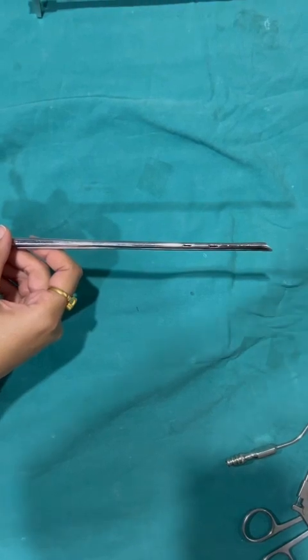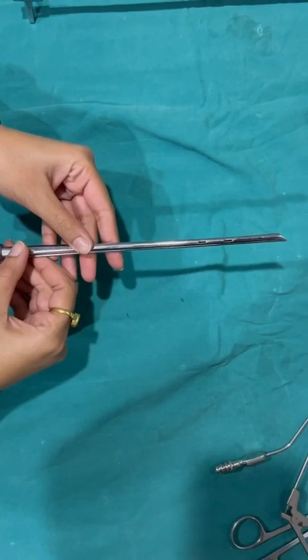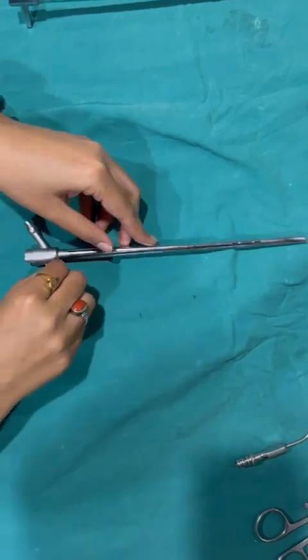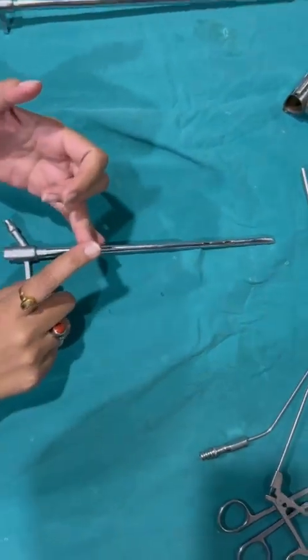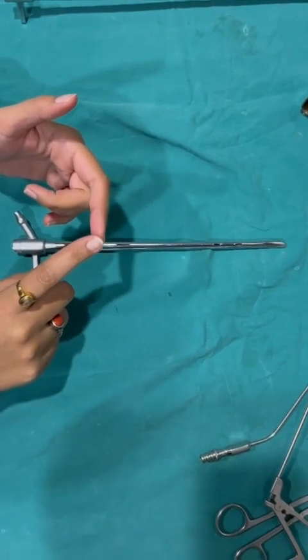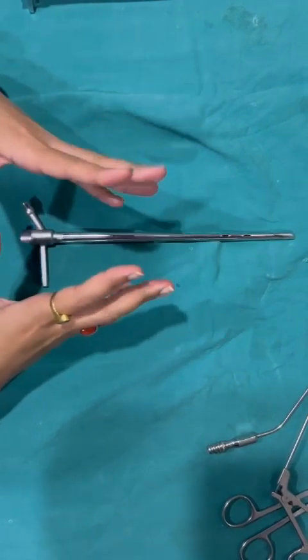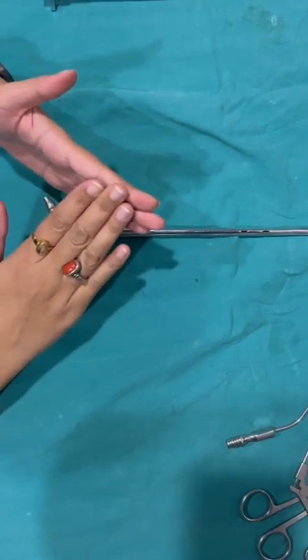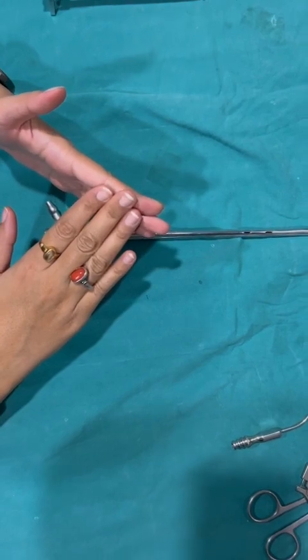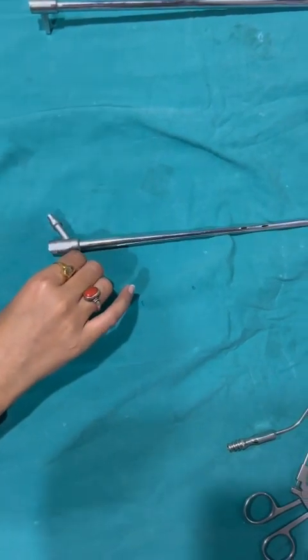The therapeutic uses are: it is used for the removal of foreign bodies, removal of retained secretion or mucus plug in case of head injury, chest trauma, thoracic or abdominal surgeries, etc., and for tracheal and bronchial stenting. The position of the patient should be neck flexed on the thorax and head extended at the atlanto-occipital joint. This is also known as the barking dog position.